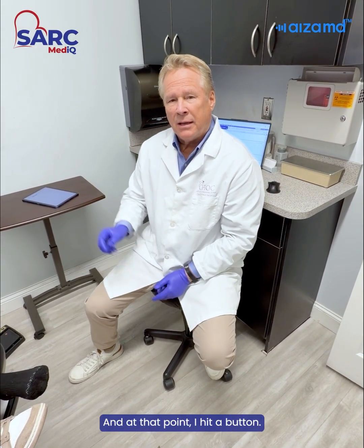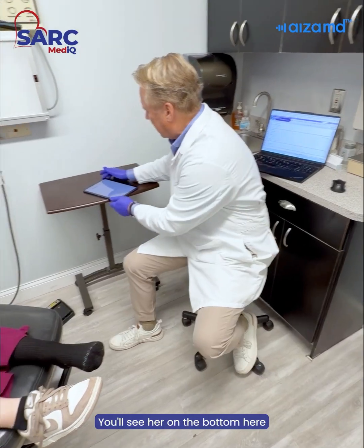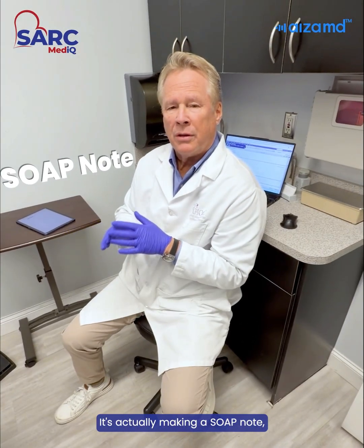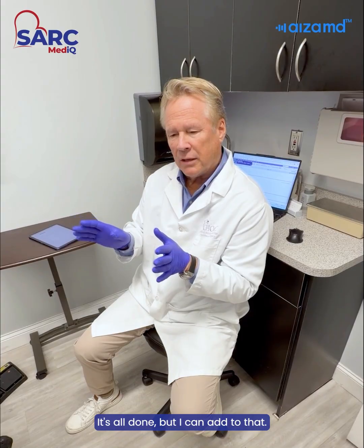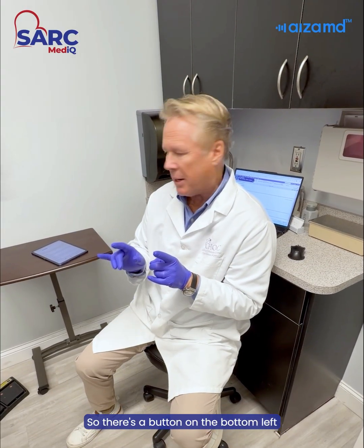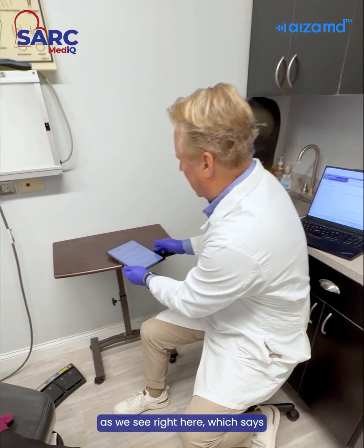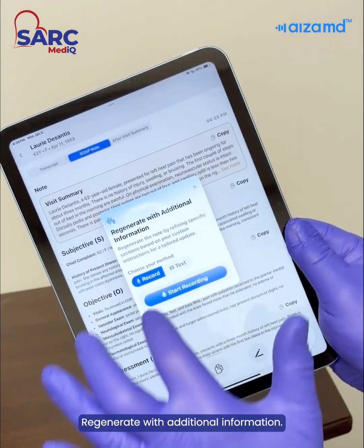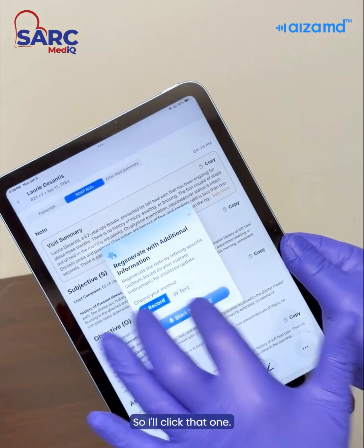At that point, I hit a button. You'll see here on the bottom, 1 sec, as it's regenerating. It's actually making a SOAP note, which you'll see in a minute. That's all done, but I can add to that SOAP note. There's a button on the bottom left, as we see right here, which says regenerate with additional information. Okay, so I'll click that one.